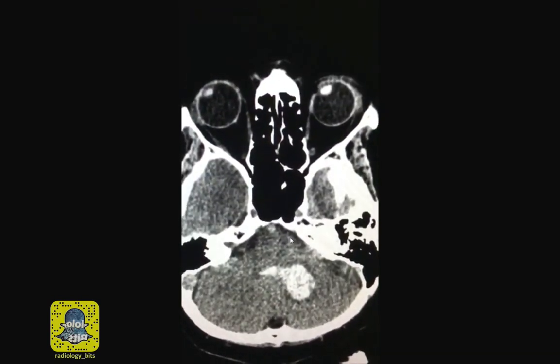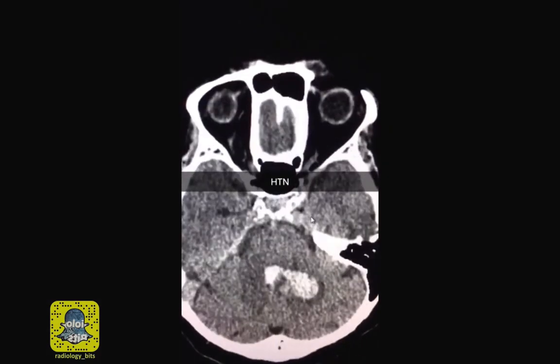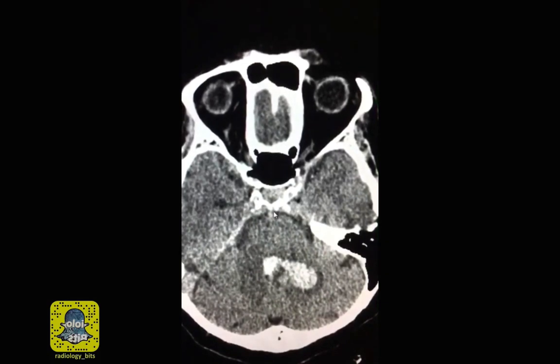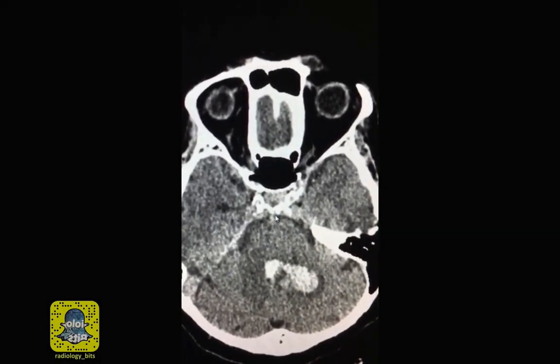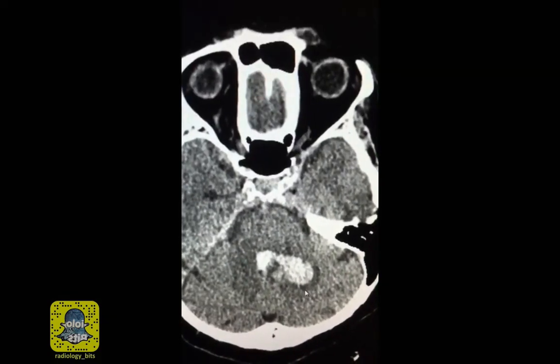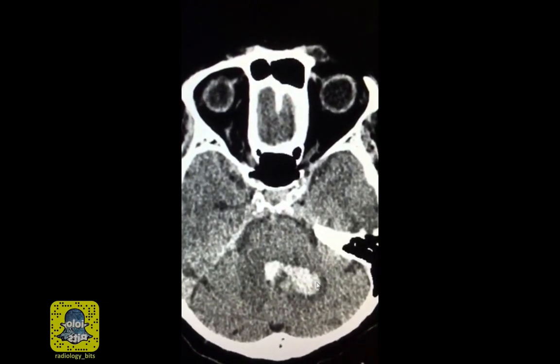Now, posterior fossa hemorrhage could occur from traumatic or non-traumatic causes. A common cause that leads to this appearance is that of hypertensive hemorrhage. We discussed the common locations of acute hypertensive bleeds in a prior clip. That's something you could go back to on the YouTube channel. The reason I'm showing the case is to talk about the effect of such acute bleed in the posterior fossa and things that you should put in your report.